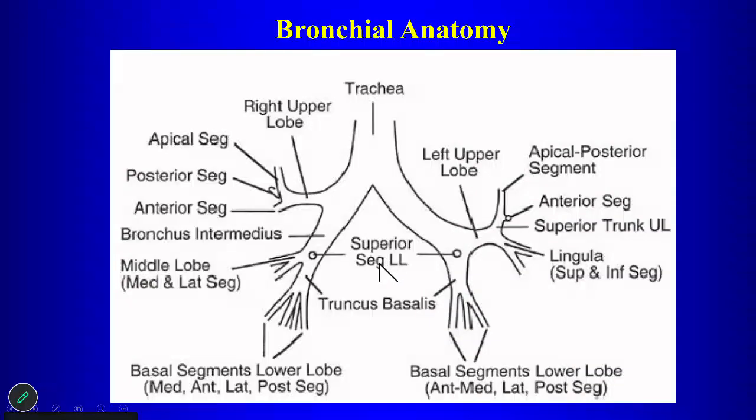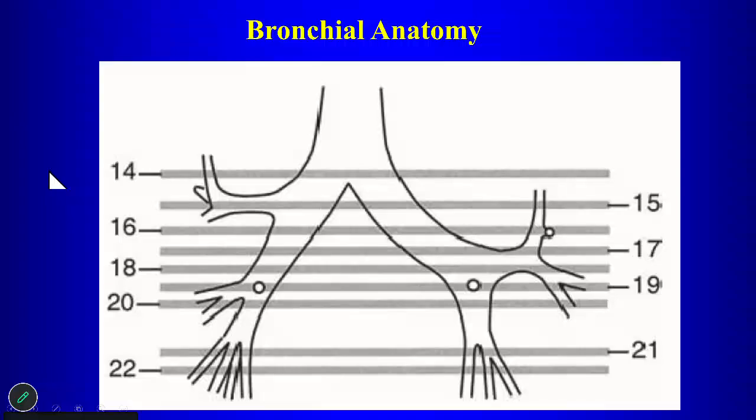So the bronchial anatomy, you need to be familiar with the segmental bronchial anatomy. The appearance of the segmental bronchi on the CT scan will depend on their orientation relative to the axial CT slice. So the trachea, you're going to be cutting in cross-section, so that's going to appear round. The right upper lobe bronchus will fall in the plane of the slice, so that's going to appear tubular, and then so on as you look at the remainder of the bronchi.